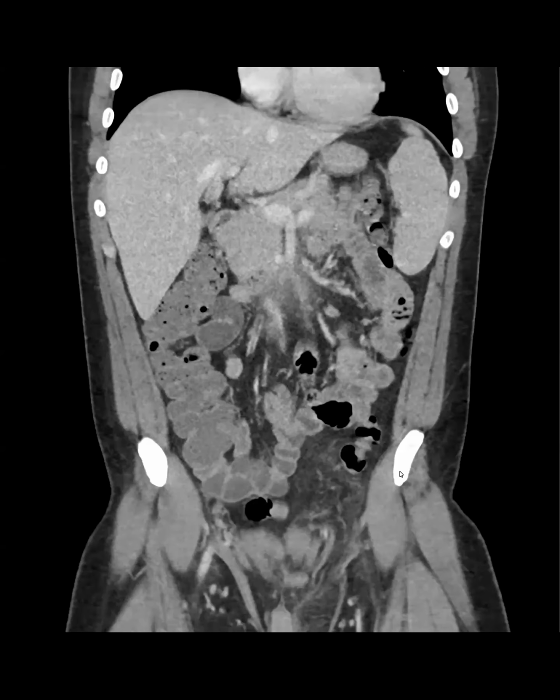There's something in the left anterior abdominal wall, right? Is that anything, or were you just on a weird slice? Okay, maybe it was just a weird slice. It looked asymmetric on that post contrast. There's something, but that it is an abdominal wall. Look here, between, oh, posteriorly, okay.